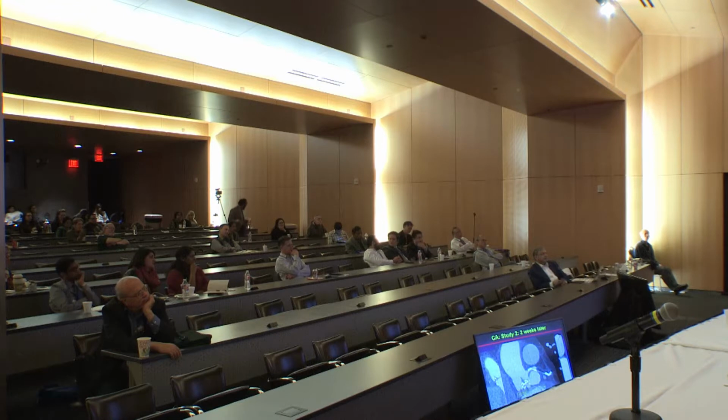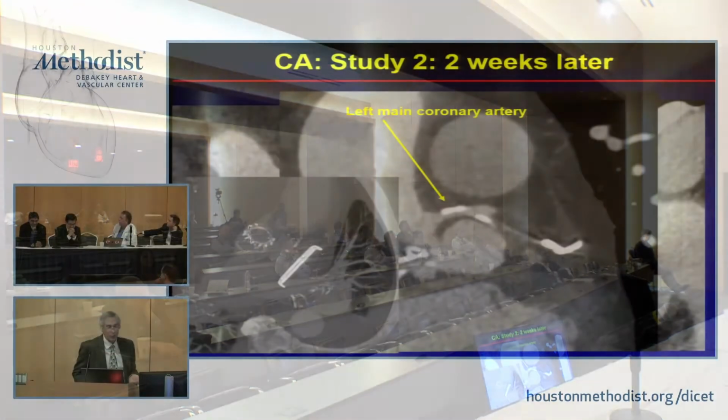So that's the left main. And incidentally, this patient, when he had surgery, not only did he have the valve, but he also had a left atrial clip put in, which you can also see.